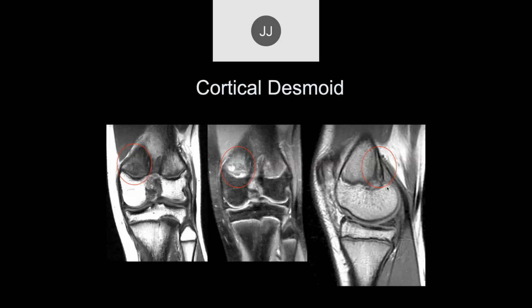It's a double line. You're saying once they biopsy it, a periosteal sarcoma is going to look similar on pathology? Yeah. When you get healing bone like this, the cells can look very bizarre, and it can be very difficult to differentiate whether they're malignant or not. Once it's recognized in a situation like this, one of the things you can do is wait.